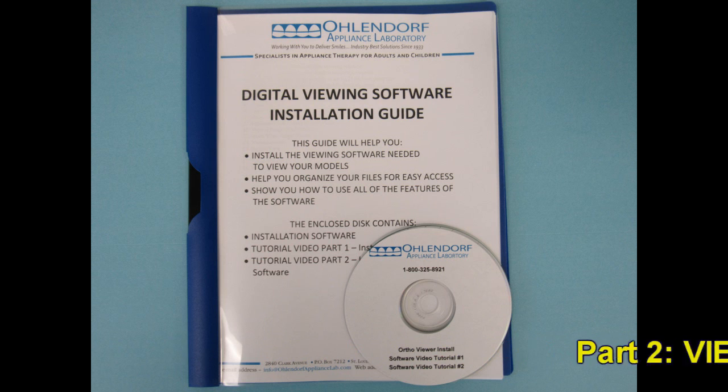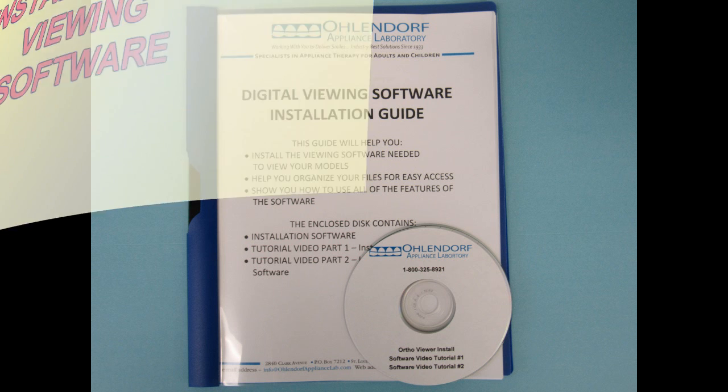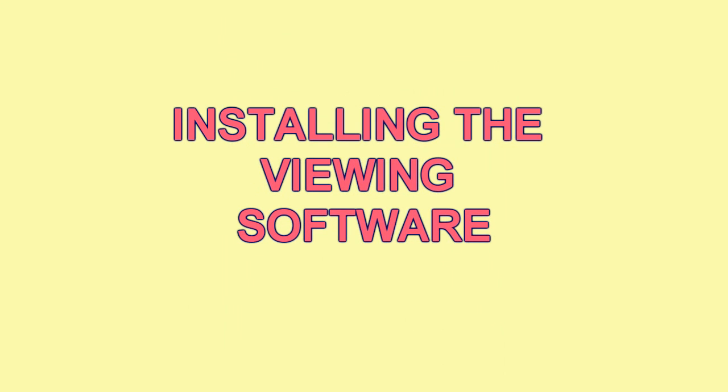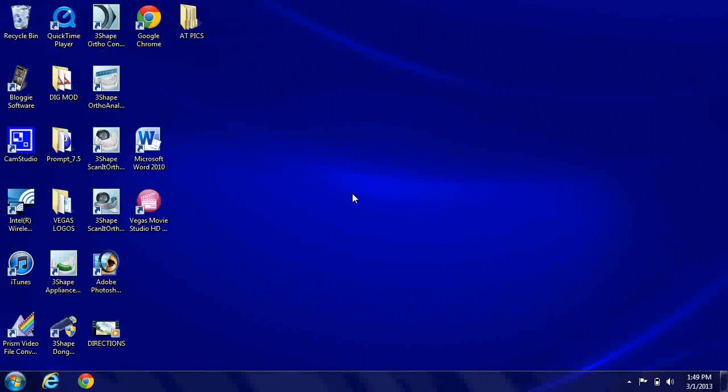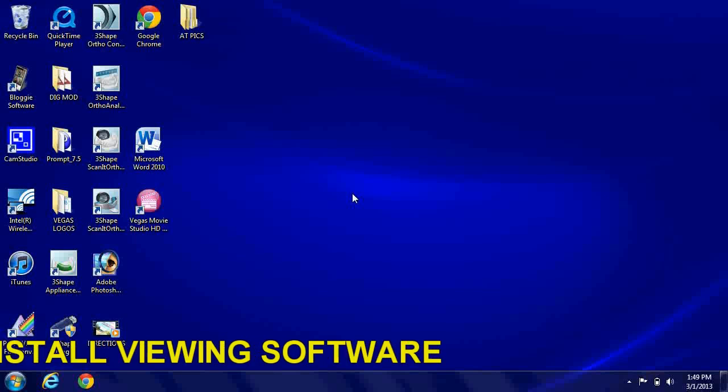Let's get started setting up your computer so you can begin viewing your digital study models. Before we get started installing the software, please understand that your computer may have a different operating system than the one I'm using to demonstrate on this video. The basic steps are the same, but they may vary depending on your computer.